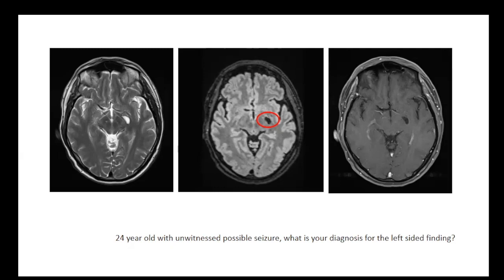Giant perivascular spaces are usually seen a little bit more cephalad in the region of the inferior putamen. This is right at the level of the ambient cistern. Here you have the ambient cistern on the other side. Here's choroid plexus. This is where the choroid fissure comes through, carrying the anterior choroidal artery and so on. So this actually is a choroid fissure cyst.